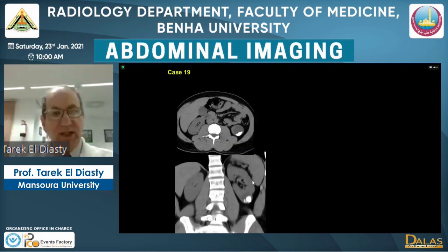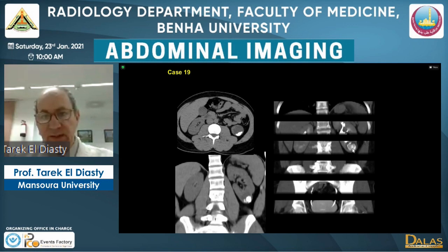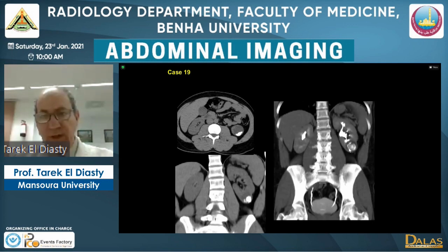What about calcification in the kidney? We have such a cystic lesion with calcification posteriorly and inferiorly in the coronal pre-contrast image. After contrast administration, this lesion shows no enhancement in the early phase, which excludes a cystic neoplasm with large calcification. So the tumor is excluded, and in the excretory delayed phase image, it shows filling of contrast in this lesion.